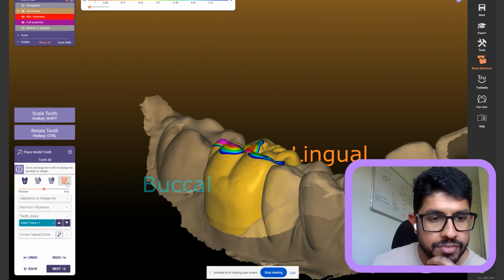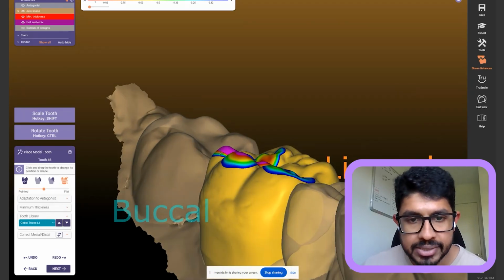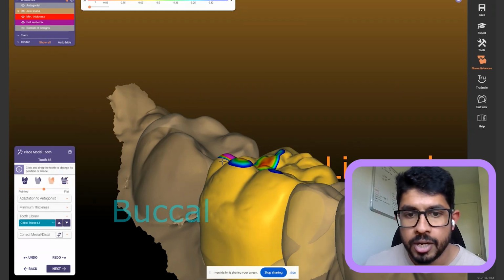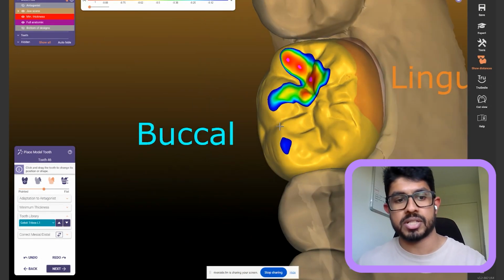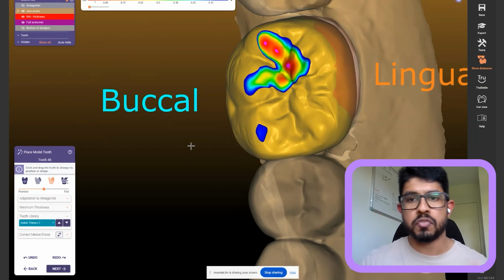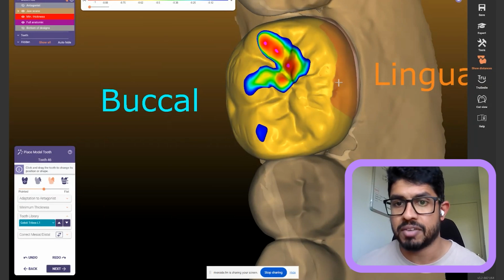Now, you have all of these options here that you can click. This option gives you the ability to freeform tooth parts, which means I can select just a little part over there, a certain cusp, and move forward. This is the same thing as edit restoration in CEREC, where you can adjust the anatomy. They have something called 2-directional, 4-directional, all kinds of stuff if you use CEREC, but this is basically the freedom that you get from all of these.